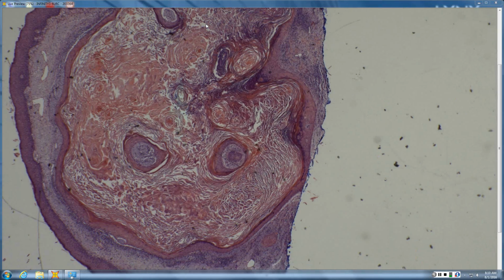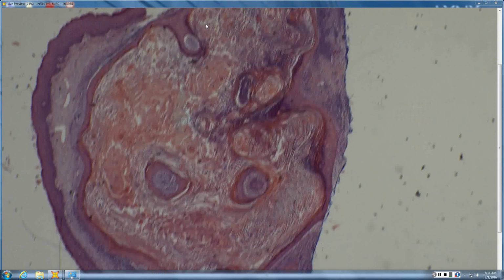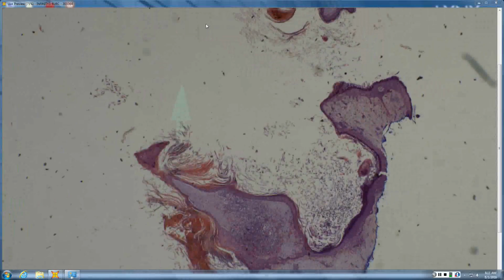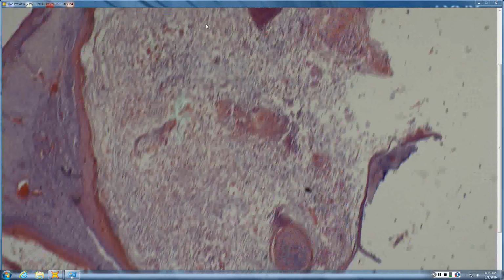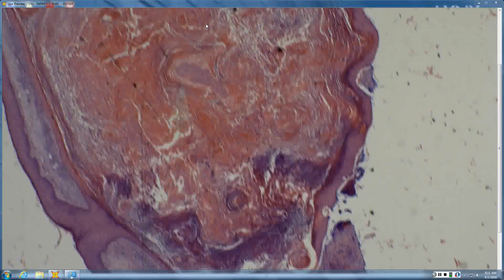Looks like a cyst in some areas. A lot of fibromyxoid stroma, inflammation. The stroma kind of looks like a fibroepithelioma of Pinkus, that kind of stroma, but I don't see a lot of the strands. This big cyst. And is it 3 cysts? So it could be a resolving KA. That's exactly what it is, a resolving KA.